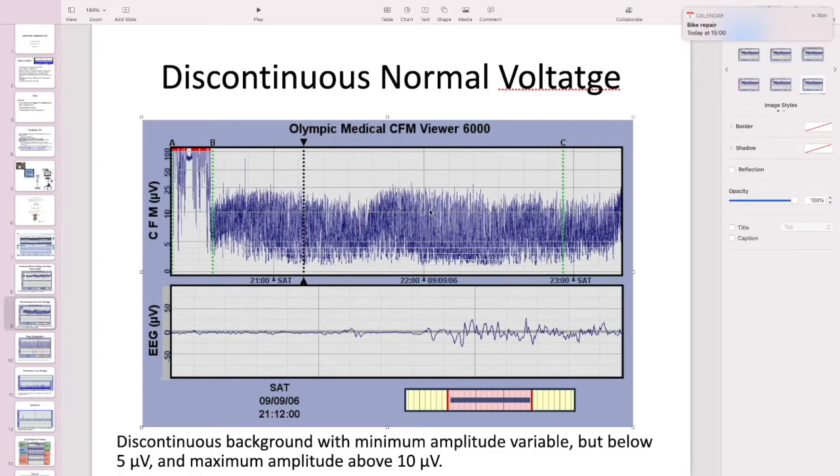So this is moderately abnormal, but actually if I saw this in a newborn that had just had therapeutic hypothermia, for example, I wouldn't be too worried at this stage. Often this kind of tracing will change to the previous one and become continuous with obvious sleep-wake cycling. So those 2 that I've just shown you are essentially normal. I wouldn't worry too much about an infant with those, but again, you have to take the clinical picture.